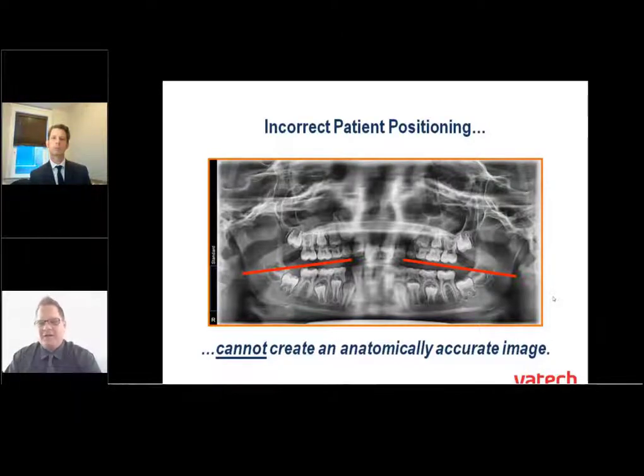So the first thing I always look at is that angle of occlusion, because obviously the anteriors are blurred, but I start with a mental checklist of what's wrong, because it usually falls in one of those. The first thing I look at is that angle, and you can see it's almost a frowny effect, and that throws the anterior teeth off, which is probably part of the reason why they're blurry. So that's just how my mental process goes. And then I notice the spine's probably out of alignment, and that whole anterior section there is blurred.